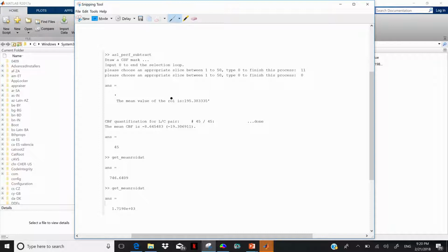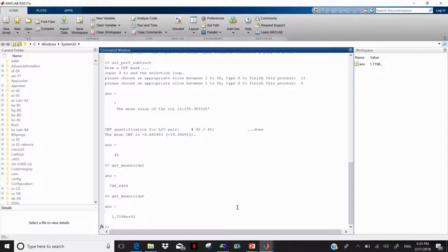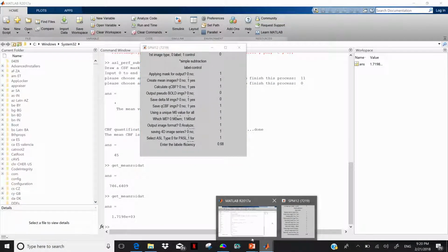What I want to tell you is that the method is very amazing and looks nice. You get all these values and all these masks, and you can actually see them and draw, so you get a pretty good idea about what you're doing.